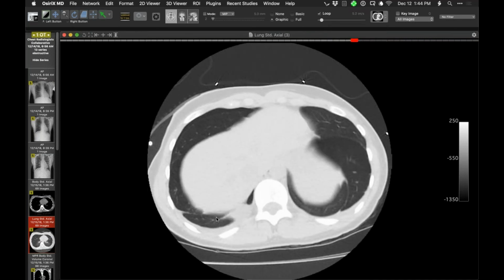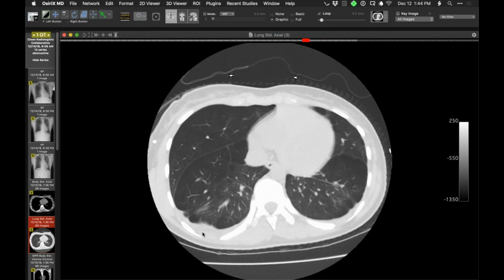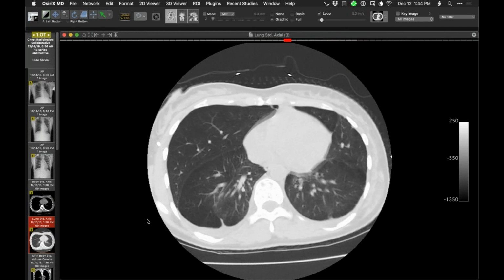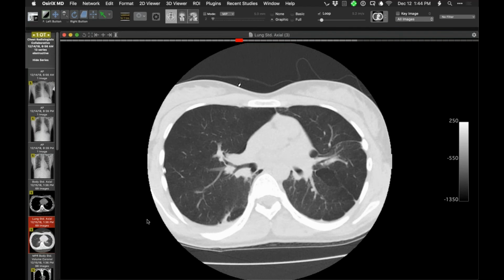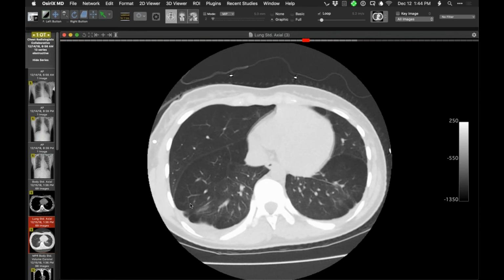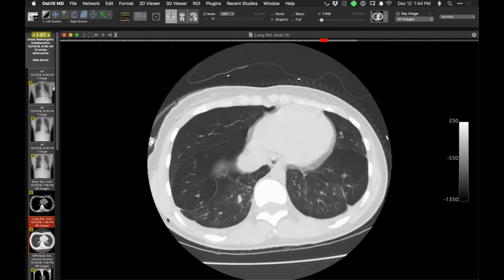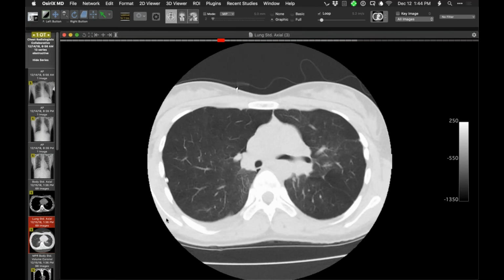So it turns out that by history, this person was a premature baby, and she was told that she had bronchopulmonary dysplasia or chronic lung disease of prematurity. And I think the imaging findings here as an adult are very consistent with that. And I don't know the exact relationship between this and the pneumothorax, but I suppose the lungs are abnormal and maybe potentially at some risk for a pneumothorax if you have obstructive bronchial disease, hyperinflation, and so on. Does anyone doubt that that's what it is? I think that I'm quite happy with that as an explanation.